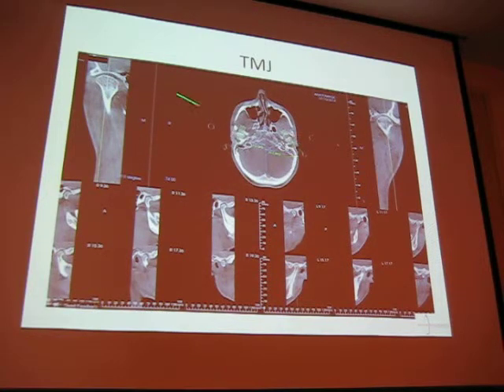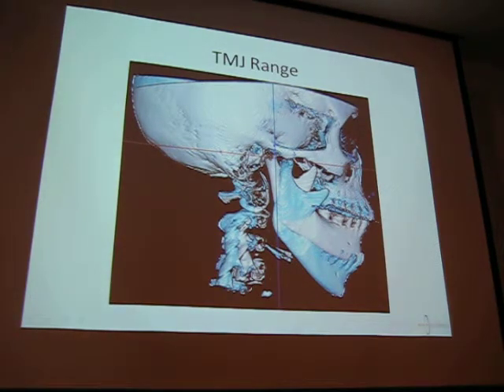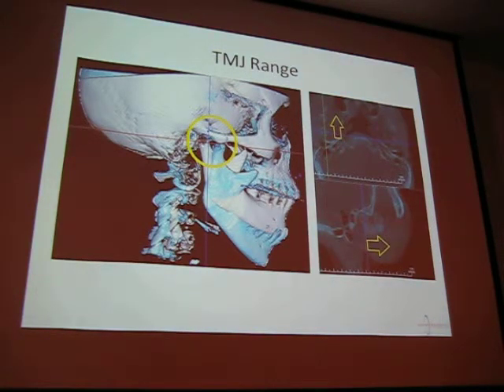It's incredibly powerful for TMJ treatment, and we can actually compare the two. We can compare the divergence of angles, we can see if there's any pathology, any resorption, any remodeling. This is really powerful for anybody who does TMJ treatment. The ability to see the articulation, and again, looking from the side, sagittally, to see when we're articulated versus in occlusion, how we come out of the fossa, how far it goes. Looking at this from the top, there's the condyle closed, open, see how it just moves forward.